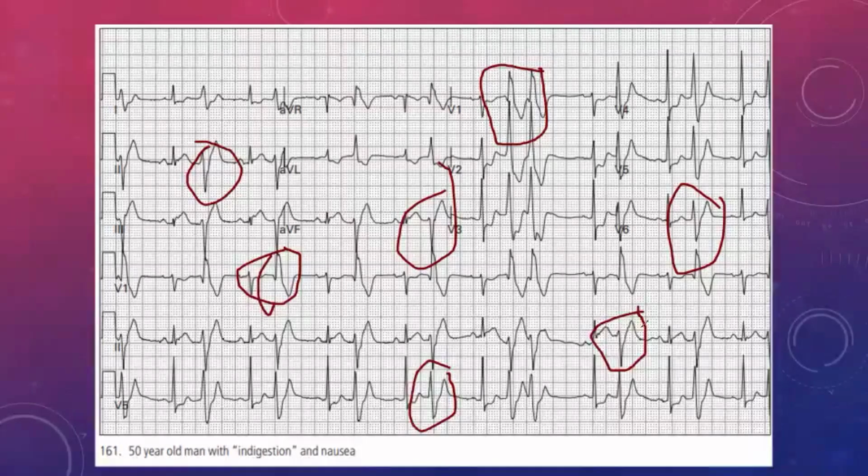It's going to make it difficult for you to look at your rhythm. It's going to make it difficult for you to decide what's really going on with it. Now, like I say, let's first look at the things that we do know. So let's take one lead, for example. So let's take lead 3. Let's just take this little lead over here, and let's take out what we already know is problematic. So this is something that is already triggering my brain, to use a modern phrase.